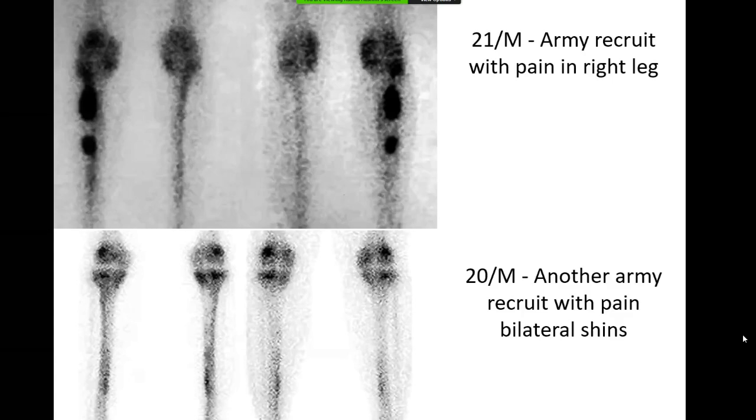Sure. So you're right about the first one. This is without any problem. This is a stress fracture. There are two focal areas of uptake. The second one is a little bit trickier.